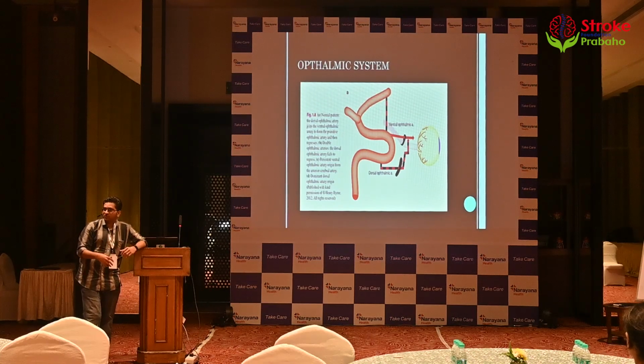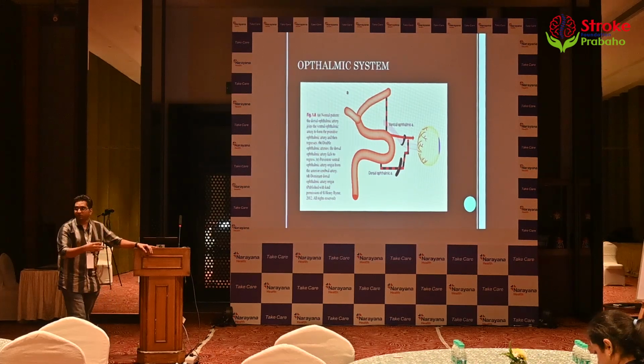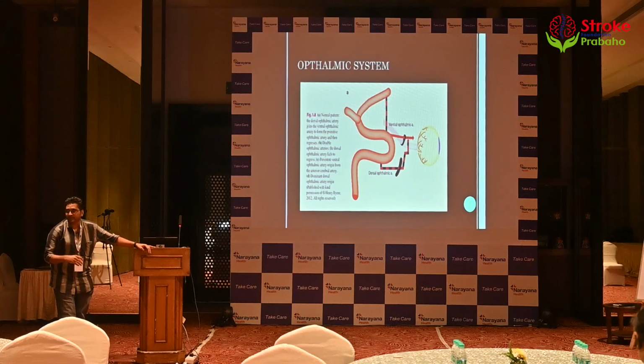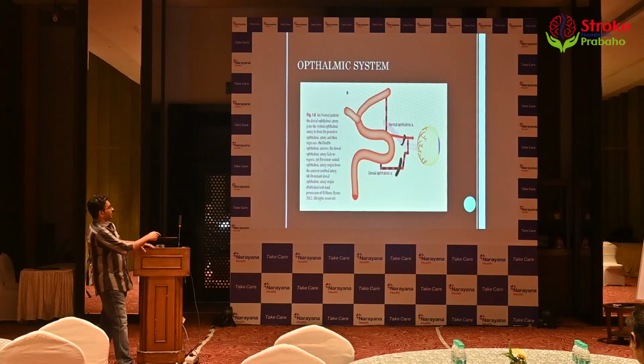I agree. T2 SPACE, maybe look at combining MR angio, T2 SPACE and the DSA with your bony landmarks. So for people who are out there, I think they should not have that thing in their mind that with the ophthalmic artery, above that I will treat, it's all intradural, below ophthalmic, it's all extradural. I want to just take that statement off. So I mean, I'll finish off that.